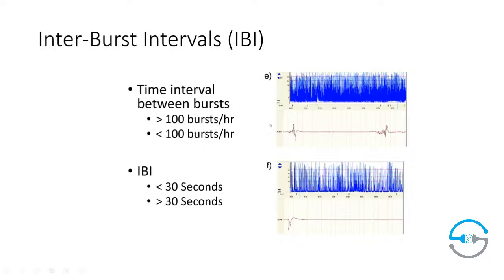And so you can see here where we have a tight, dense band. This is still burst suppression. You have a flat lower margin, you have bursting over here, you have a very thick bandwidth. But because it's so dense, that tells you that there's more activity. There are more bursts happening. So I hesitate to say that's a better sign, but there's certainly more activity.